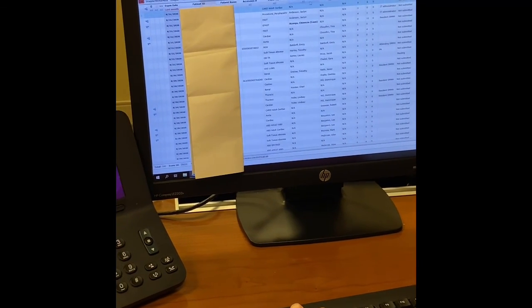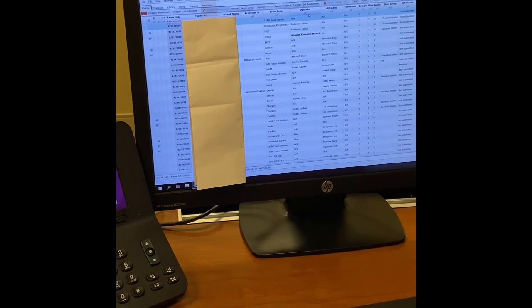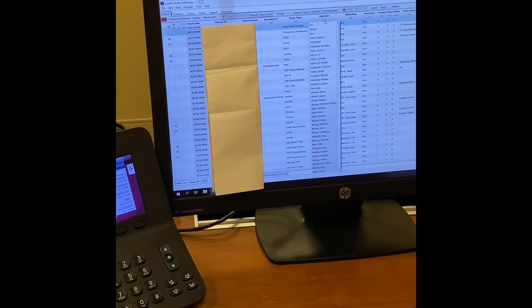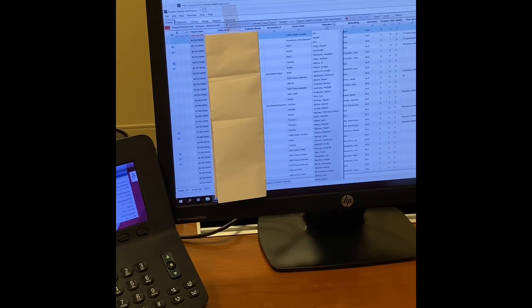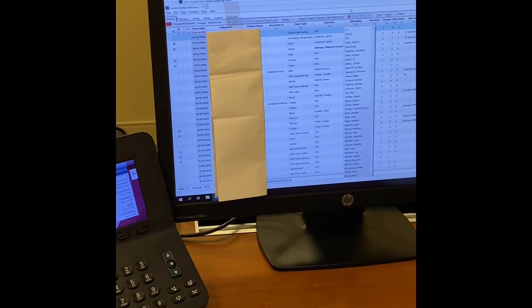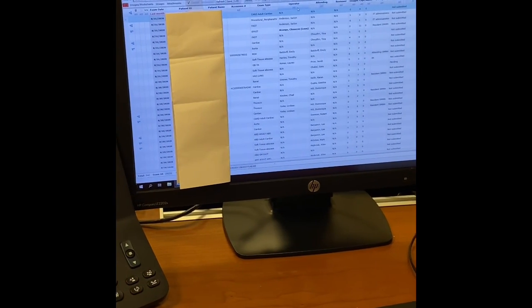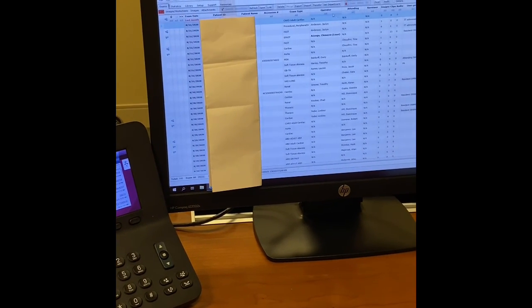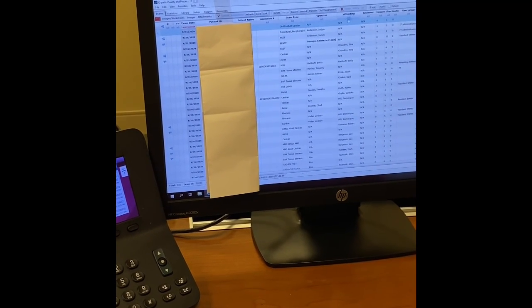either under operating or attending, depending on which field you put your user ID in, clicking myself. Then you will only see the studies that you are a part of. You can't click myself on both columns at the same time because this is not an either or, this is an and function, and your name is not in both fields at the same time.